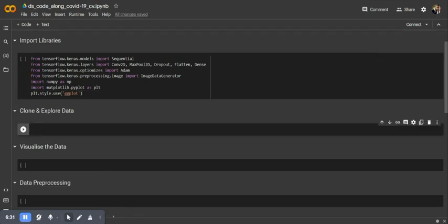The next thing we're going to do is import our image data, and it's conveniently stored in a repository on GitHub. So we will steal the images from there: github.com/education454/datasets.